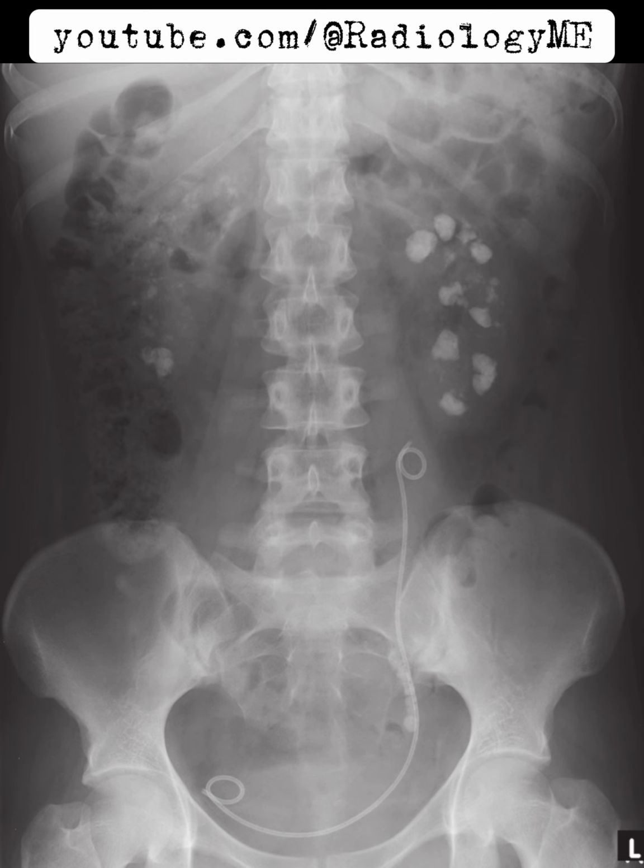And speaking of stones, there's also something else we need to talk about: the plastic stent we can see. Its proximal end is in the mid-left ureter, but it's also extending down to the bladder, indicating it's migrated. Along with that, we see a row of calcifications in the distal left ureter, which is very characteristic of Steinstrasse, or a stone street, of calculi.